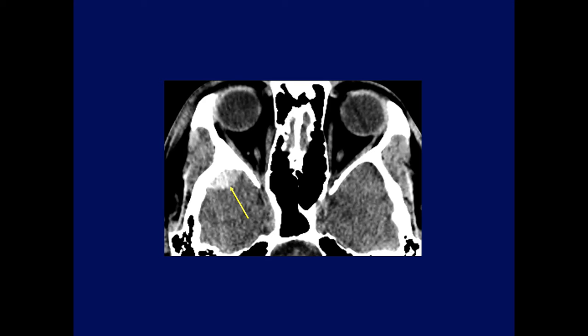Okay, what do people think about this meningioma? This is a trick case. I'm starting with my trick cases. This was not a meningioma, but looks like one for sure. And correct, Asif hit the nail on the head. This was an epidural hematoma simulating a meningioma.